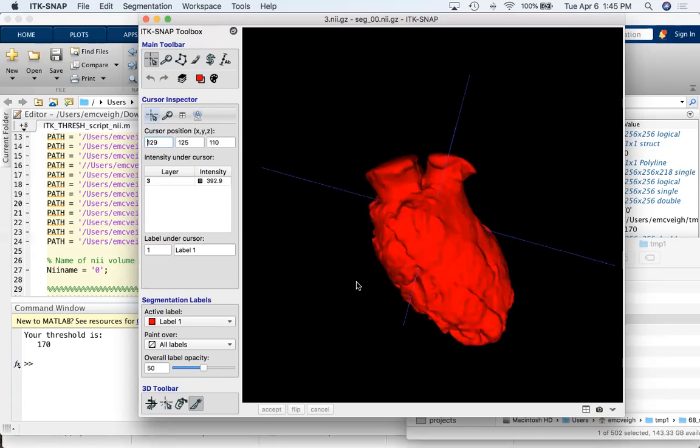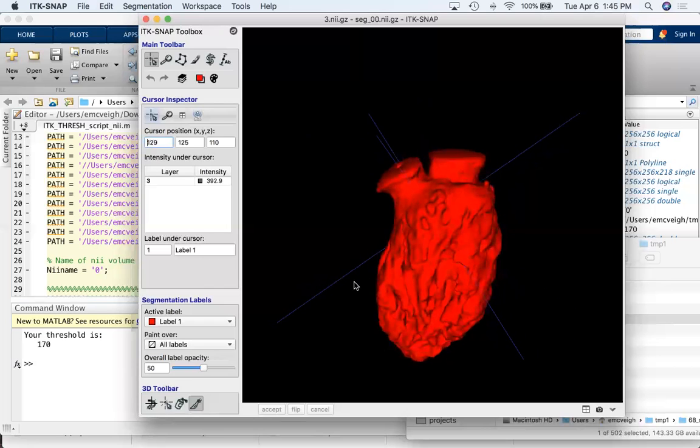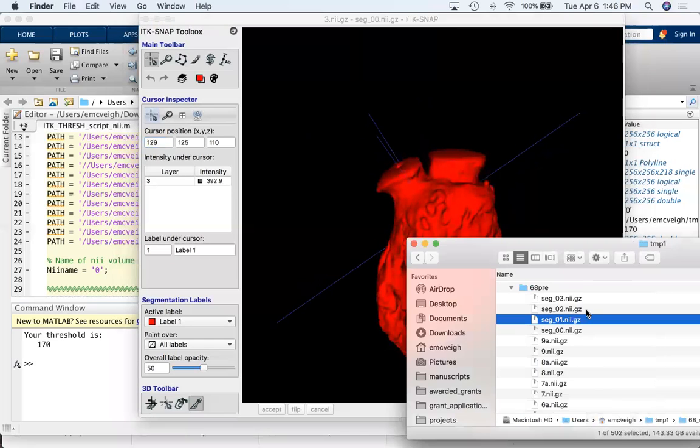I'll zoom up. And you do that in which one? In the last one, or are you already still in 3? In 3, okay? Starting with 0 right now. So I reloaded. I went to the here and I reloaded 0 by dragging it in, from the very beginning with each segmentation. Well, now I have 4 segmentations, right? So I'm cutting short. Usually I would just generate the whole 20 and then go back and do this editing on all 20. Yes, okay.